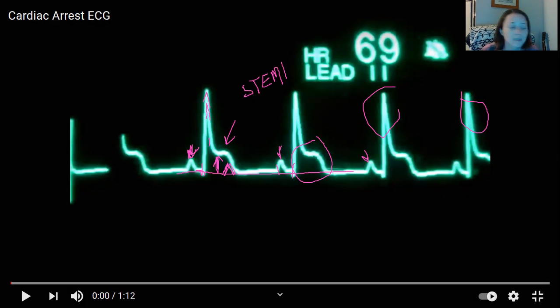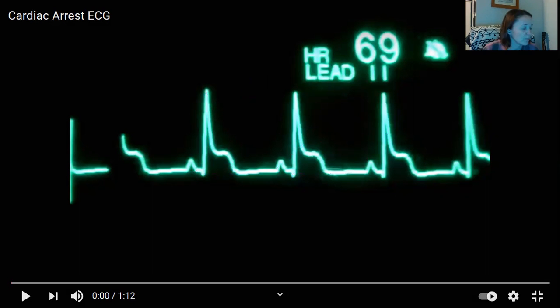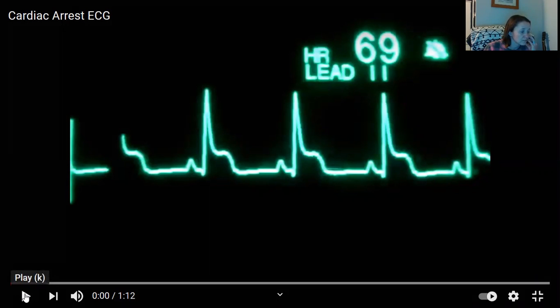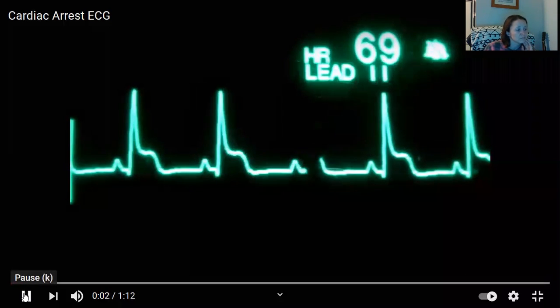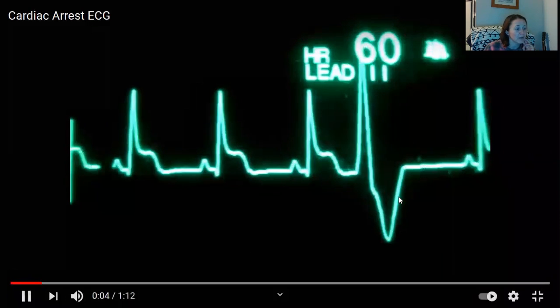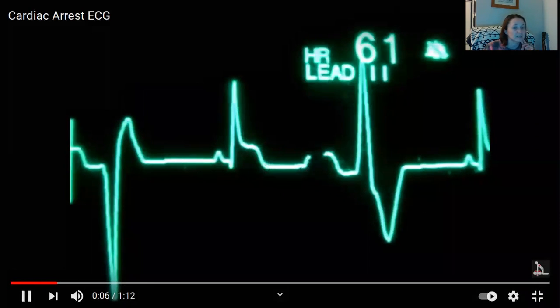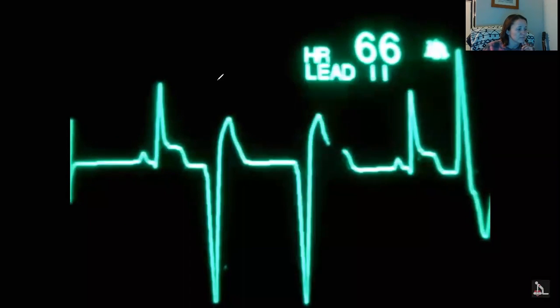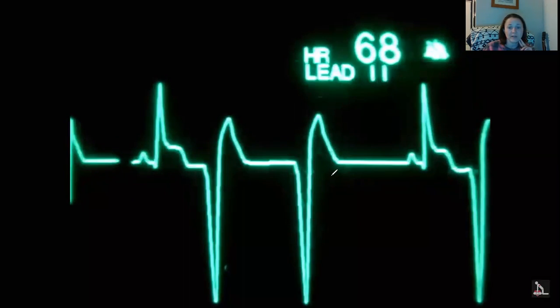So let me clear all my drawings, and then we will start this video of rhythm progression. Sorry about the dramatic music. Okay, so we've got PVCs popping in. They're starting to gather together with their friends.